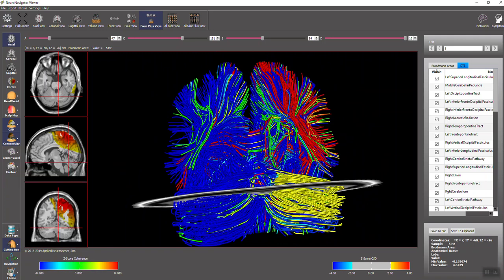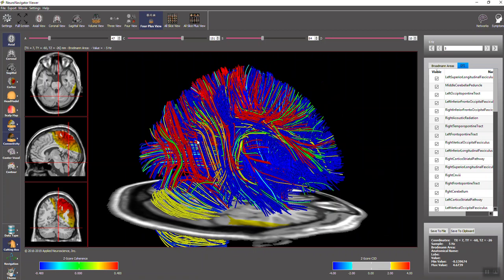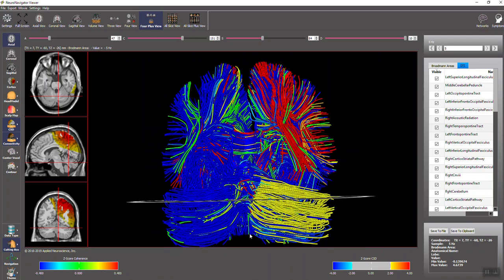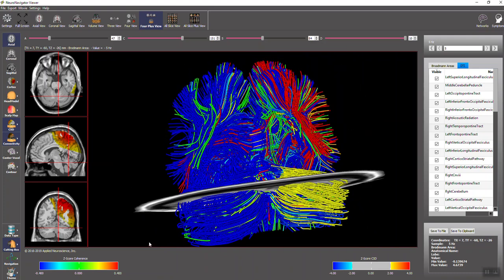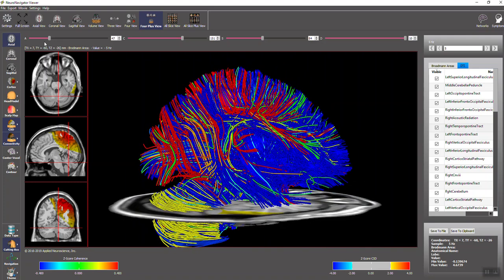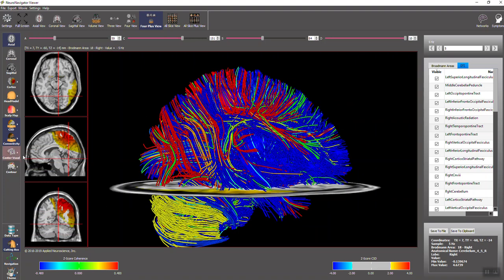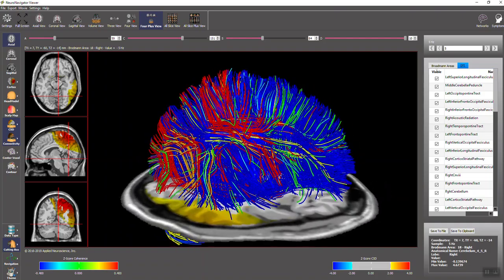I've set the z-scores here in the lower coordinate scale, so I'll go show them all. But what you can see in this scale is the right parietal region, and the right hemisphere in general, is hypercoherent, and there's a large asymmetry in the cerebellum between the left and the right cerebellum. We can move the slice up and down, and zoom in a bit more if we wish.